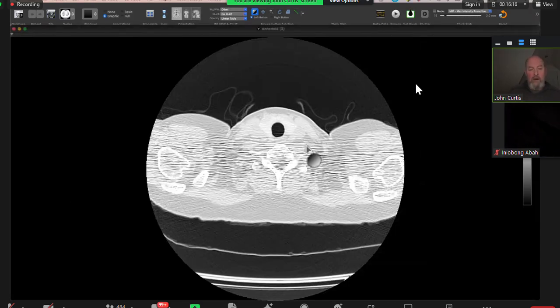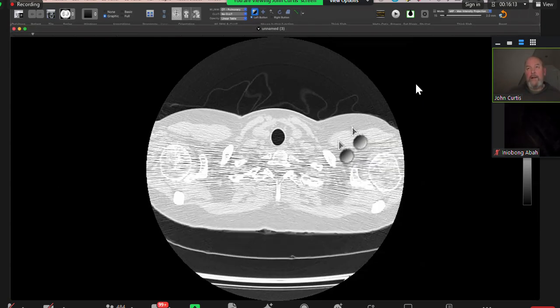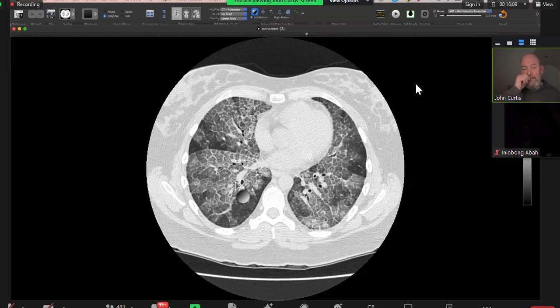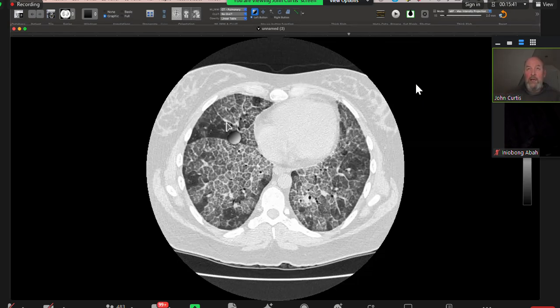This was very good. Alveolar proteinosis. It's so classical, I would not regard anything else as causing this. But of course there are lots of causes of crazy paving, such as interstitial pulmonary edema. Okay, that tends to be less marked than this. Early infection, pneumocystis, viral pneumonias, lipoid pneumonia, the list goes on and on. But actually, if it looks like this, like a map of the world, geographical, it's going to be alveolar proteinosis, which is what this was.